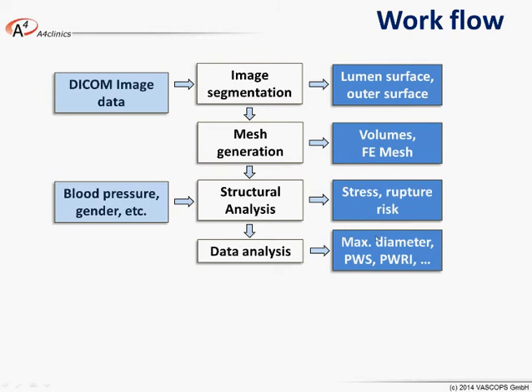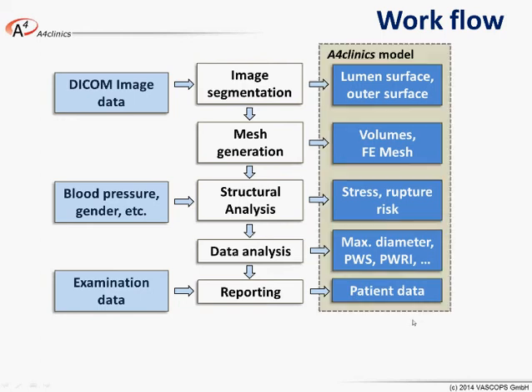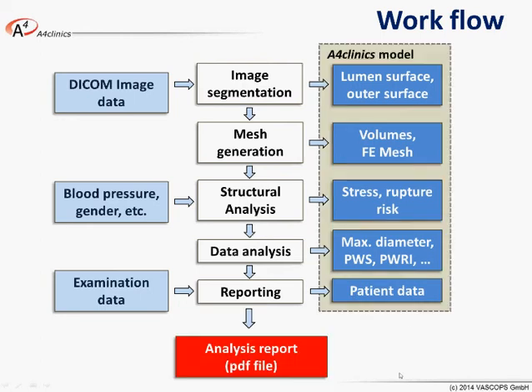Then comes data analysis that extracts from all this information the most important determinants, so geometrical determinants and mechanical determinants. And then there's finally a reporting tool where the user can add some other information, and at the very end you get an analysis report as a PDF file, which you then can communicate to others.